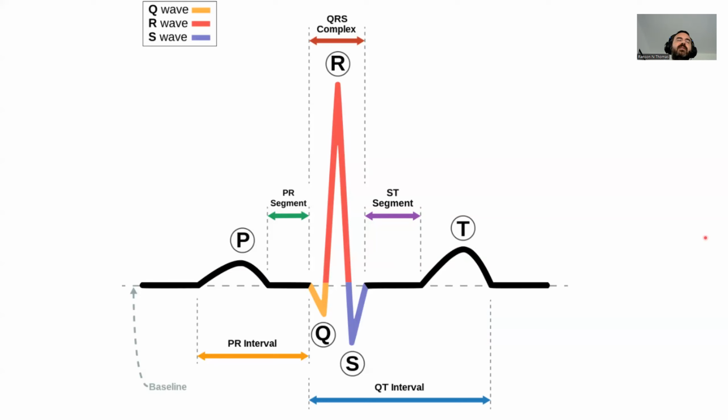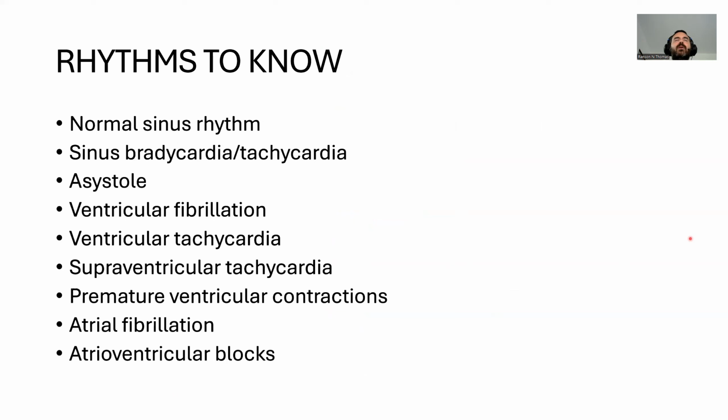So I'm just making you aware of it to understand that when you see a rhythm strip like this, you're seeing the maximum voltage that's happening in the heart at any one moment, right? So when you see a QRS, if they're in atrial fibrillation, for example, it's still fibrillating. It didn't stop, right? It's not the most important thing to understand with AFib, but there are some other situations where it might be important. It's more just understanding what we're looking at, how these rhythms work, and how to actually go about interpreting a strip.